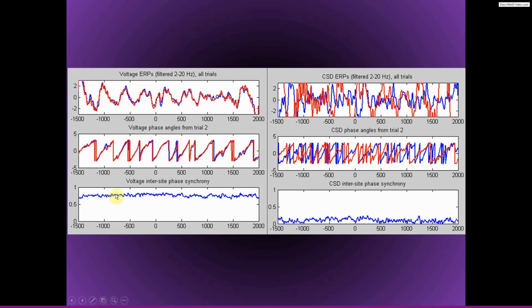So it looks like the connectivity is very high, it's close to 1. Visually, it looks like these two electrodes are really doing basically the same thing. But that's really because of volume conduction. These two electrodes are measuring activity from the same sources in the brain. But now when we apply the Laplacian, we can see that the Laplacian has helped to decouple these two electrodes.